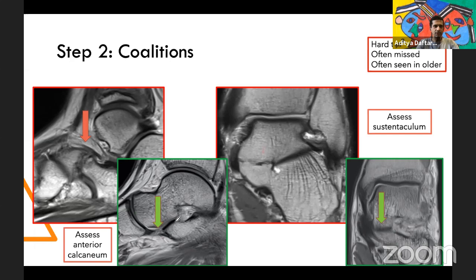This little flat band here on the sagittal images, and this is the navicular coming here. So this area is very important on the sagittal images. And you can see in this patient with a coalition how there's that beak coming here. There's a little irregular area here and here. And then the navicular becomes like this with a little irregular area here and another area here. And this essentially is your calcaneonavicular coalition, which is primarily osseous, but the last little bit is a fibrous bar over here.